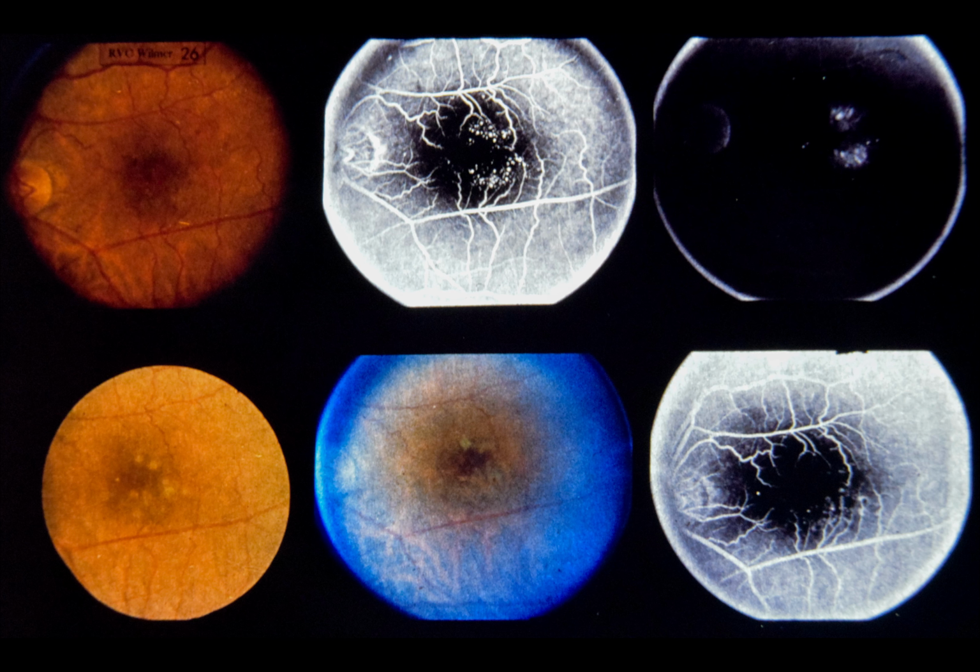This patient was photocoagulated on only one occasion, but many patients require 2 or more separate treatment sessions, 1 to 2 months apart, before all microvascular abnormalities causing macular edema are obliterated. Even in the favorable cases, visual improvement may not occur until several months after resolution of macular edema.